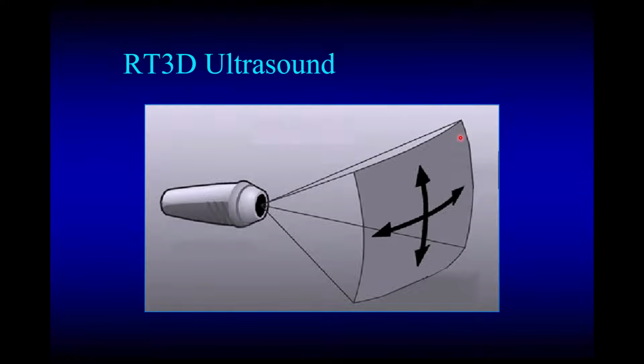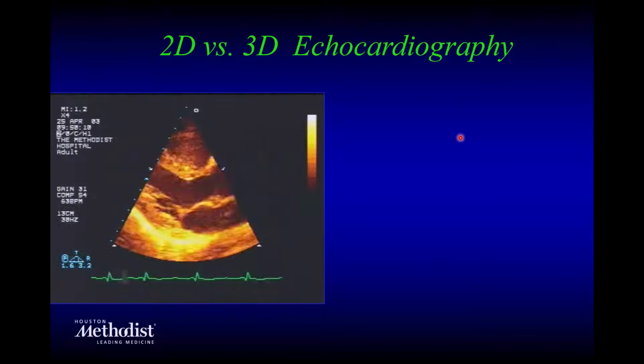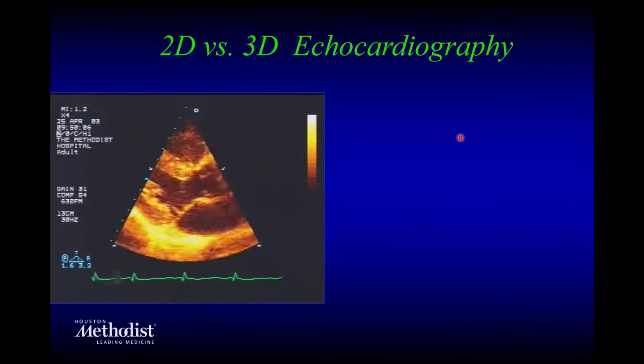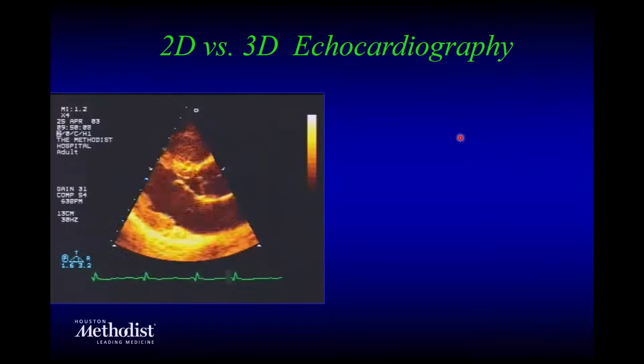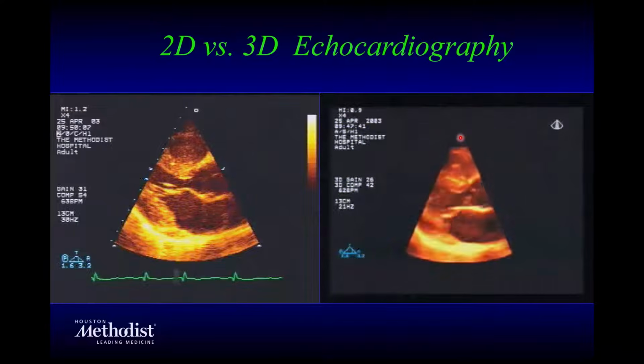This is the standard. 3D, a great advance, particularly I think its implications at this stage of the game from the transthoracic point of view is ventricular volumes, regional function, and ejection fraction. I think these are going to be very important for us.